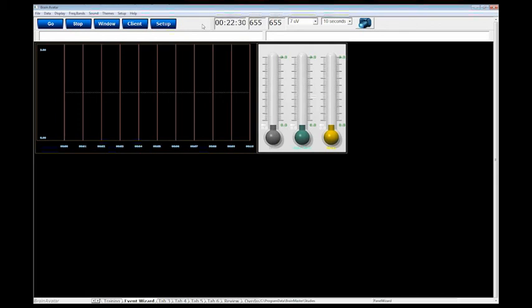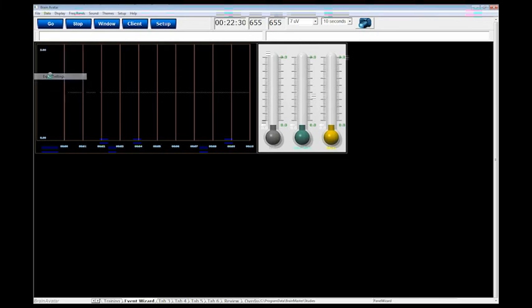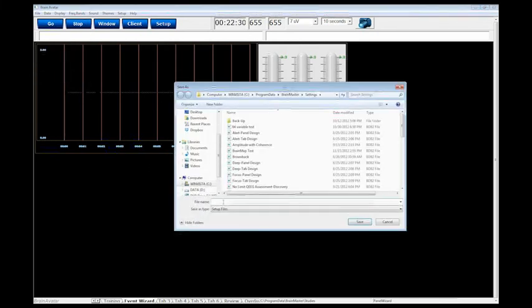No, Beth. There isn't anything special you need to do about exporting settings. Simply File, Export Settings, name the file what you want, and hit Save. That's it.